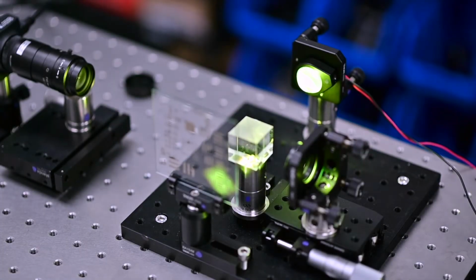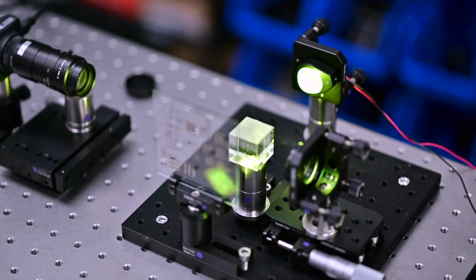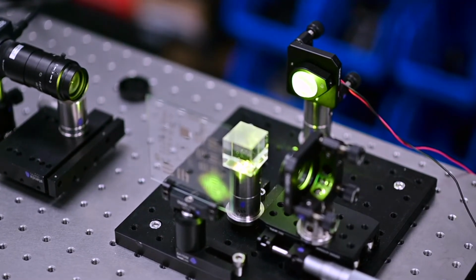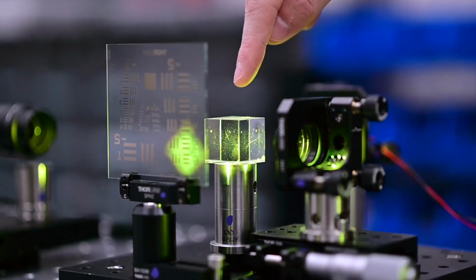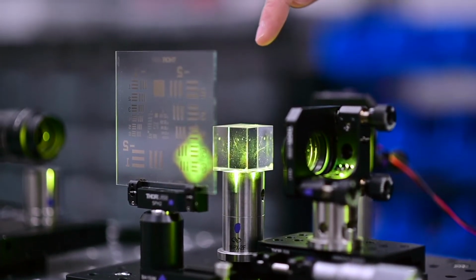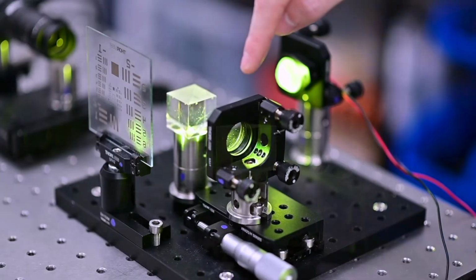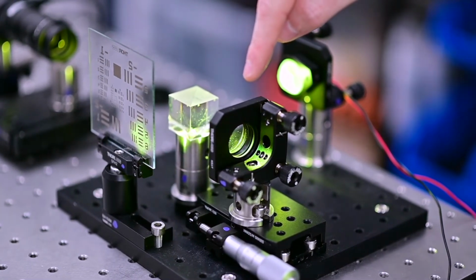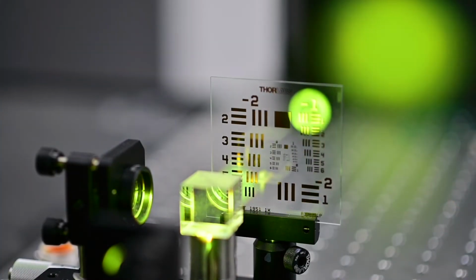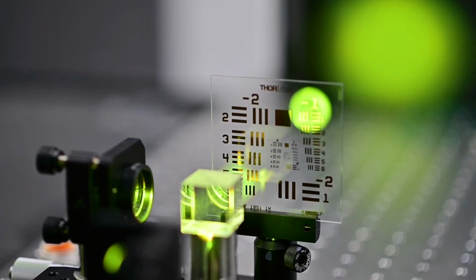The principle of OCT can be generated using a simple setup. In this setup, a lensed broadband LED emits light towards a beam splitter. The beam splitter is used to split the light into a reference arm and a sample arm. In the reference arm, there's a mirror which redirects the light back to the beam splitter. In the sample arm, in this case we've used a resolution target, which is glass with reflective lines on top, which also directs light back towards the beam splitter.